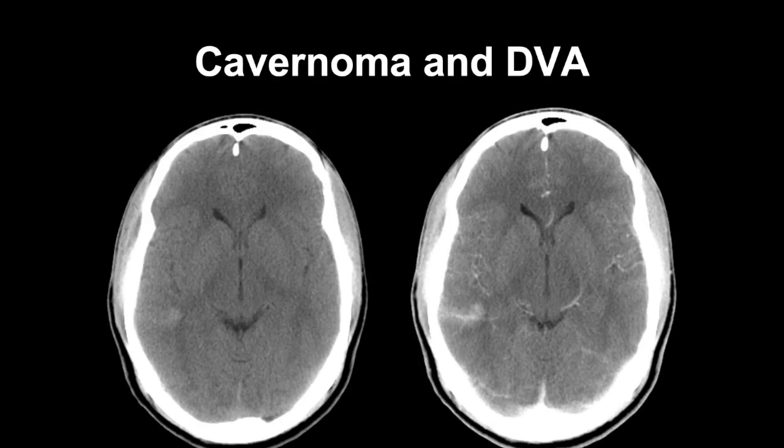but sometimes as a complication of those DVAs, patients can develop cavernoma, which is this kind of pocket of blood that can appear as hyperdense. It also tends to calcify. I'm going to show you a couple of examples later. And typically DVAs, again, are just abnormalities, but they don't have consequences. Cavernomas, on the other hand, can rupture and cause intracranial hemorrhages.